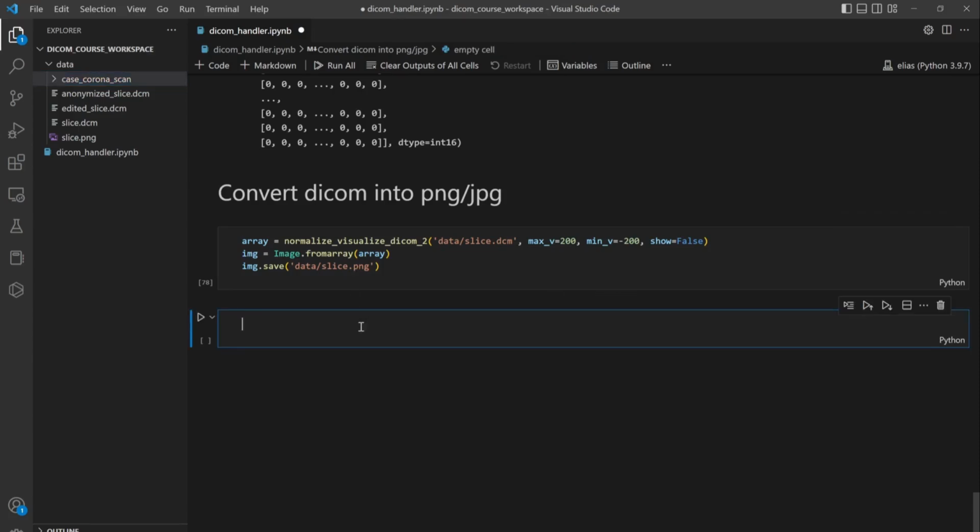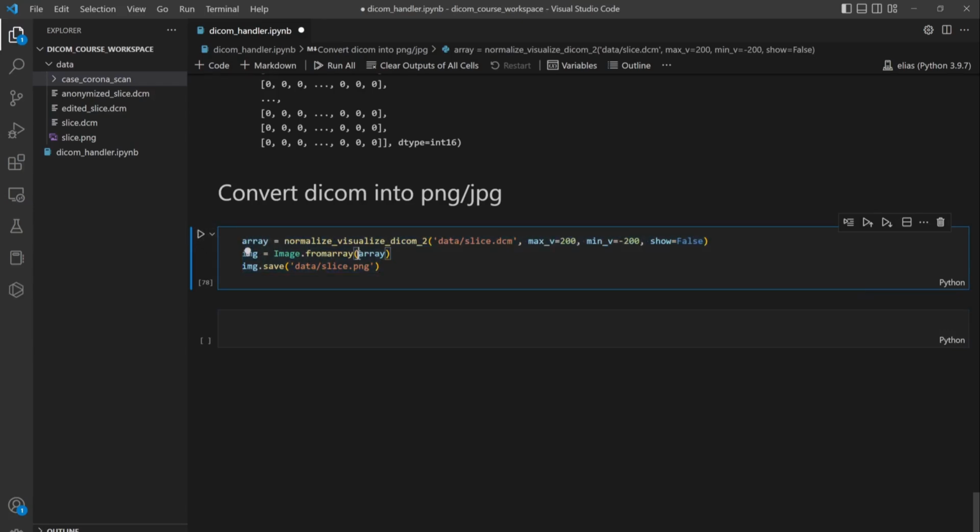We can directly create everything as a small script in a cell, or we can create a function using this approach and then apply the same thing for the whole directory, calling only this function instead of creating everything again and again. Let me show you how it looks.